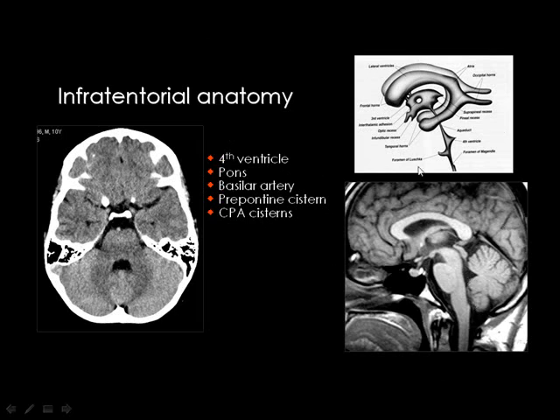And you know from this image obtained by MRI that anterior to the fourth ventricle is the brainstem and posterior to the fourth ventricle is the cerebellum. If you look here, this is the fourth ventricle and this is the brainstem anterior to it, and this is the cerebellum posterior to it. You know that the cerebellum is composed of the left hemisphere, the right hemisphere, and the cerebellar body, which is known as the vermis of the cerebellum.